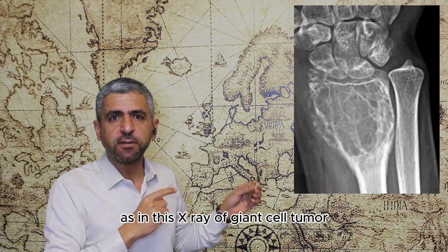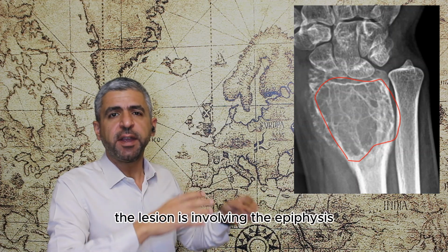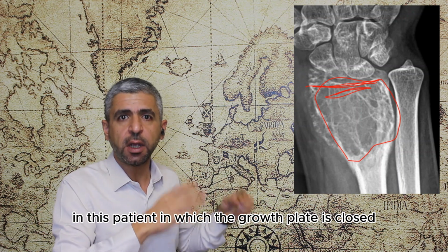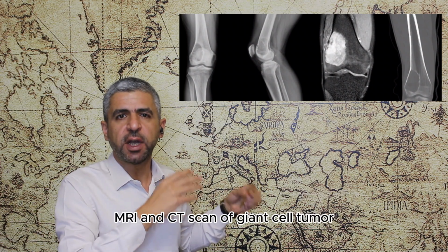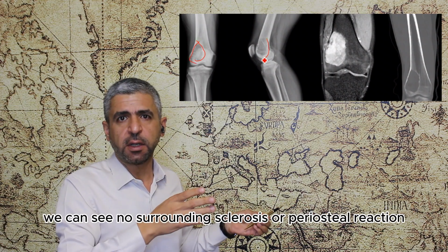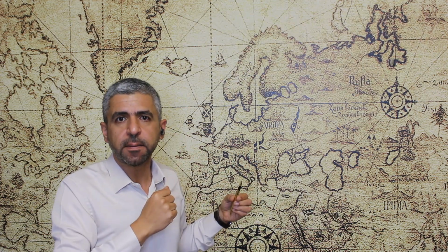As in this X-ray of giant cell tumor, we can see there is no surrounding sclerosis or periosteal reaction. The lesion is involving the epiphysis with involvement of the articular surface in this patient in which the growth plate is closed. Another example of this X-ray, MRI, and CT scan of giant cell tumor, we can see no surrounding sclerosis or periosteal reaction. The lesion is involving the epiphysis in this patient with closed growth plate.